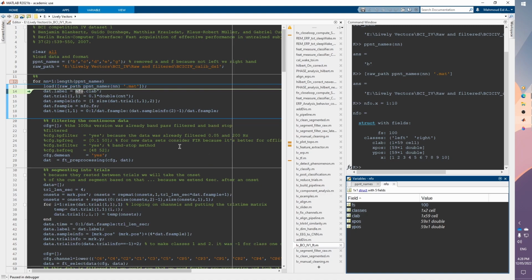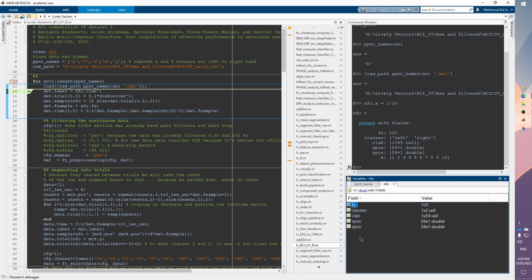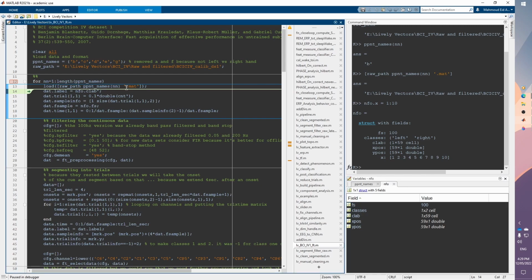Like if you are putting the name of the sensors, you wouldn't expect this to be of the same data type as the microvolts or the amplitude values of the actual signals. So it's just nice to have this data type and put all the information of your signals inside.